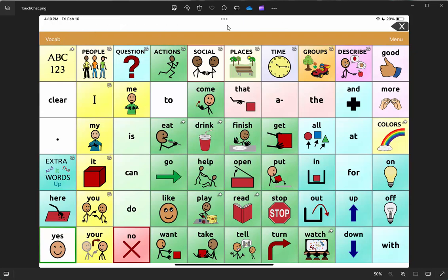Then we have the upper message bar and the upper command bar, and then this space representing the virtual home button. So I'm going to hide this status bar, expose the upper message bar and the upper command bar, but I'm going to hide this lower message bar.